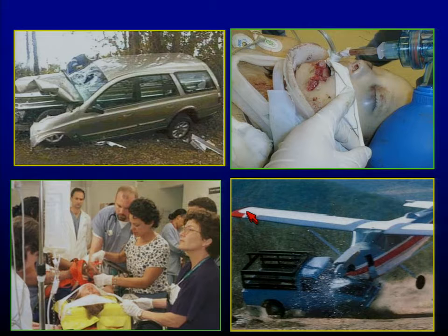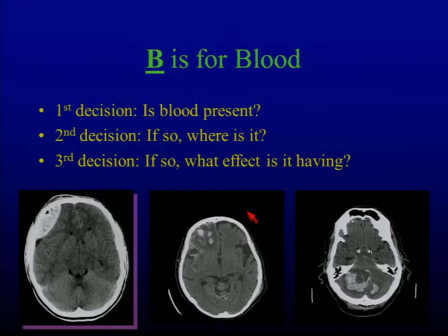So now we get out of the painful part of the lecture and move on to the more enjoyable part of the lecture, which is looking at pathology and examples of all the bad things that can happen inside somebody's brain.